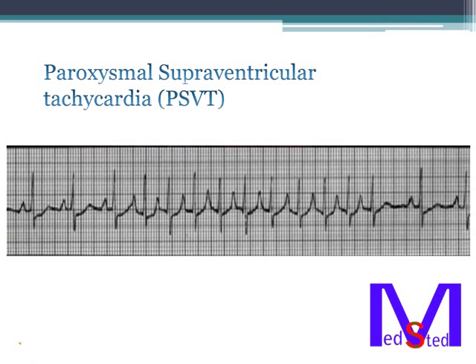This is a special kind of supraventricular tachycardia. Notice that at first the rate is normal, but just for a few seconds it got tachycardic suddenly. Suddenly means paroxysmal. So this wave is paroxysmal supraventricular tachycardia or PSVT.